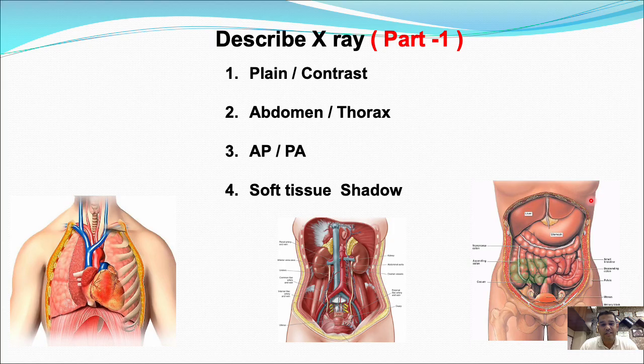Here somewhere has to be the fundus. This is the body. This is the antrum. So this is the normal anatomy. Next is the ascending colon. This is the transverse colon. This is the descending colon. And then you have the sigmoid and the rectum. And in the center you have all these small bowels. This is very important to remember when we discuss this X-ray.